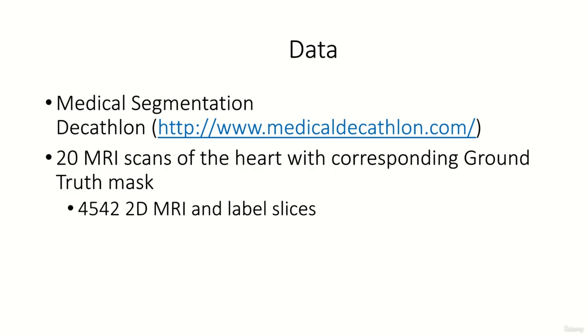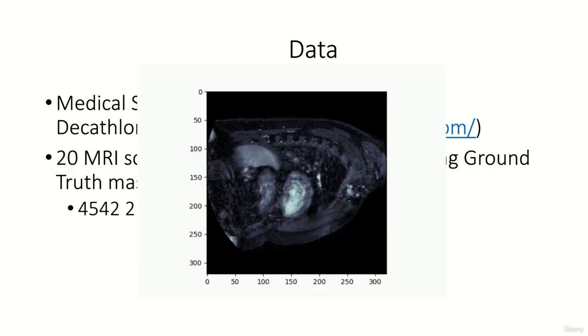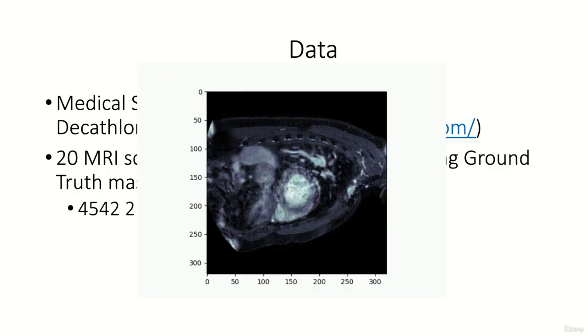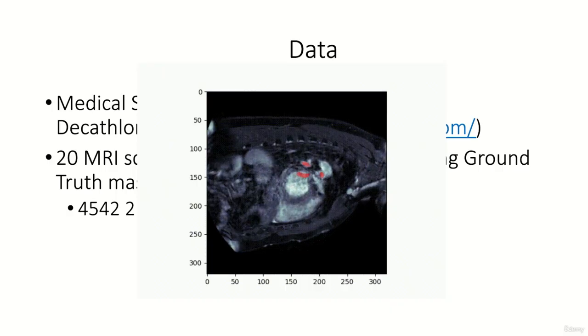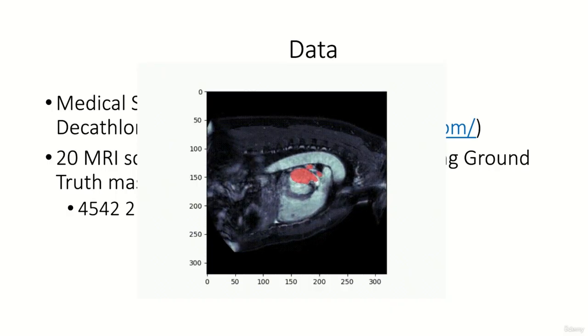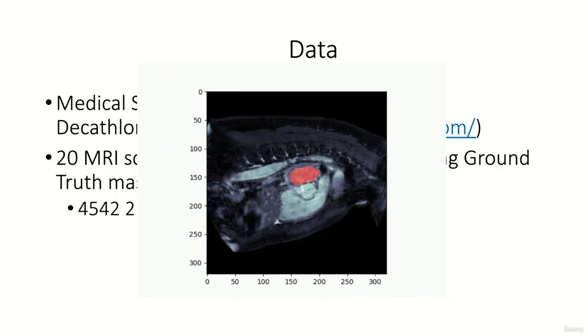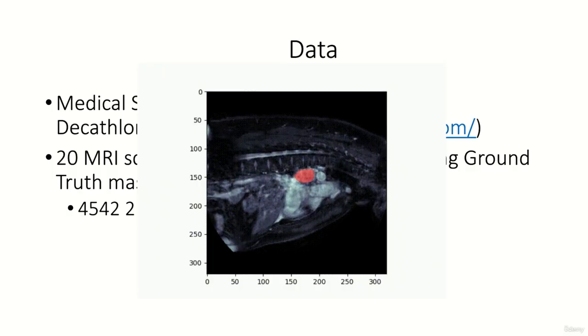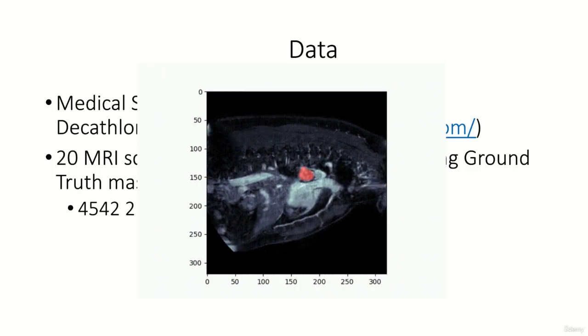Now it's time to take a look at an example. This video shows one example of the dataset. You can beautifully see how at first the left ventricle joins in, followed by the left atrium, which is visualized by the red segmentation mask. Can you imagine why it looks like the patient is lying on his stomach? Please take a second to think about this.